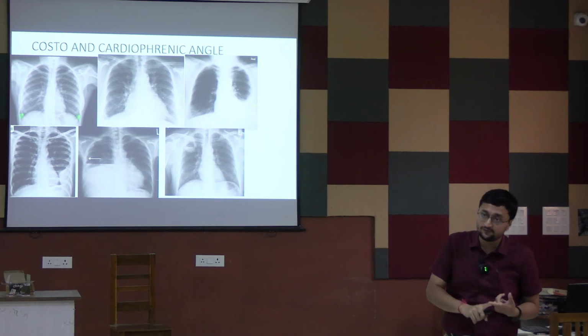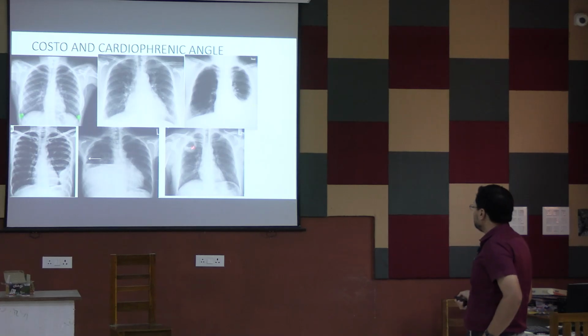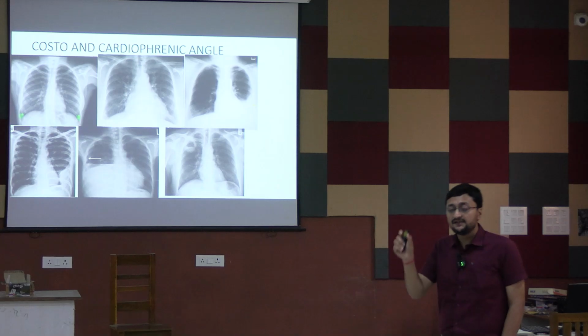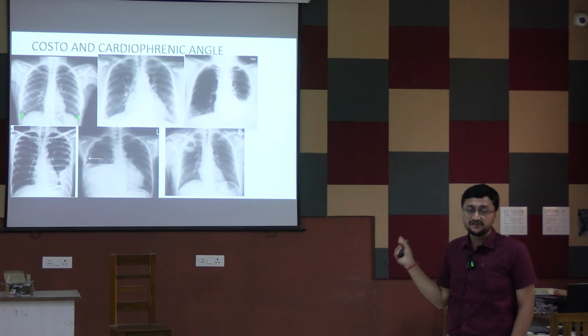That means this is a case of hydropneumothorax. Whereas in that case the air fluid level is inside the cavity and this is not through and through. So this is a case of lung abscess. Clear?